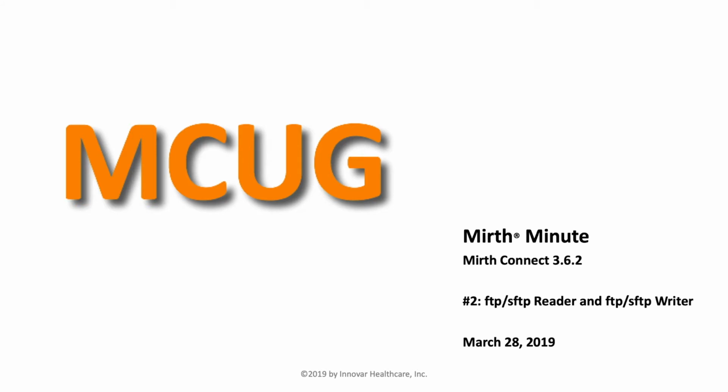We'll be working off of Mirth Connect 3.6.2. Today, this is installation number 2 of this series. We'll look at the FTP and SFTP reader and FTP and SFTP writer.